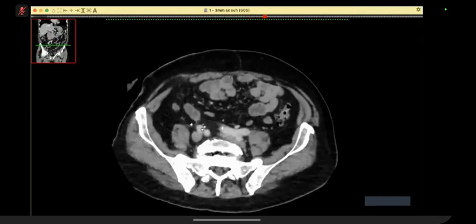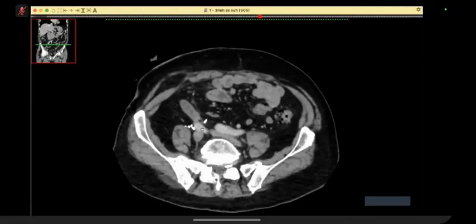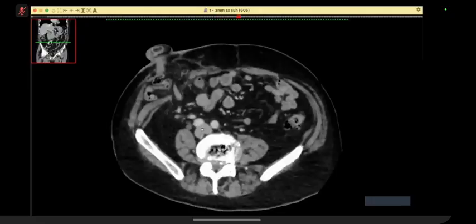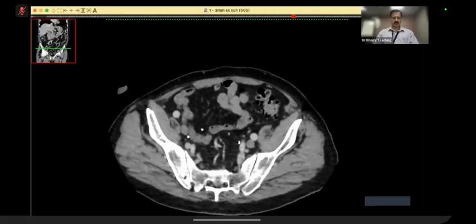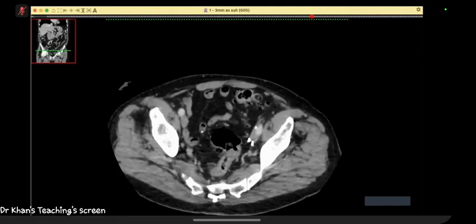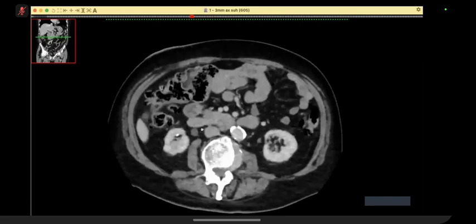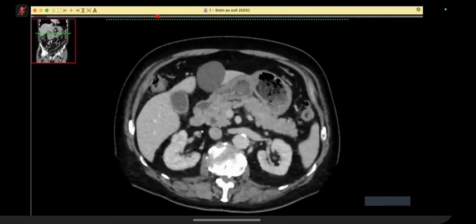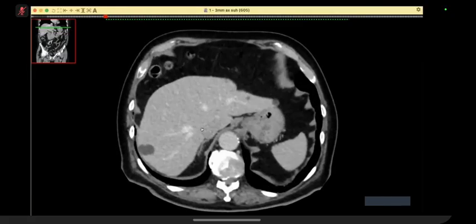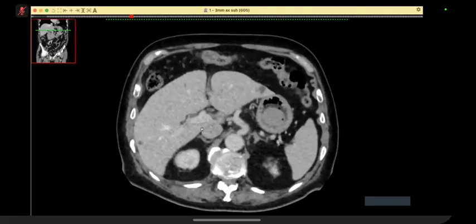Okay, in the lower abdomen, the ureter appeared to deviate towards the right. Towards the right, so what has happened? With such deviation, if it was medially, I would think of retroperitoneal fibrosis. But if it's lateral, I'll be worried about a mass in the retroperitoneum. But I can't see any obvious mass there. So the deviation could be iatrogenic.